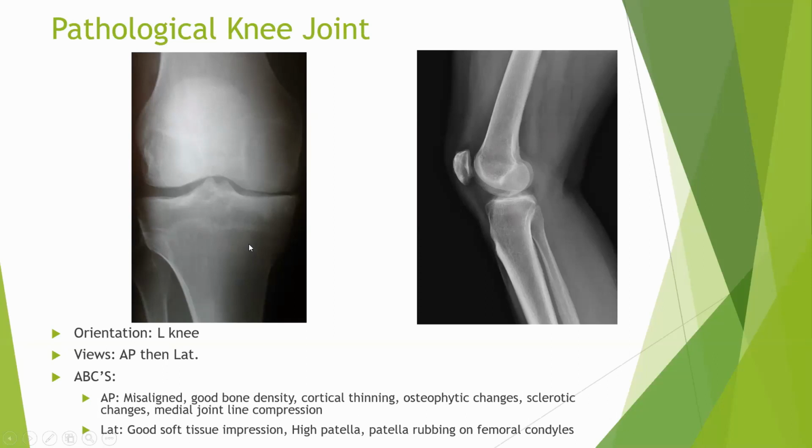If someone has osteoporosis, it will be inconsistent shades of gray in pockets, because osteoporosis doesn't mean the entire bone is osteoporotic. If that happens, then the patient will never come to you. There will be a stress fracture or crack fracture or whatever type of pathology. He or she will not be able to walk to your clinic and say, I have this kind of picture. But to me, there are no pockets. It is completely consistent, and look at the trabecular lines. Such a beautiful trabecular line shows to me that it is not osteoporosis, or it is basically good.